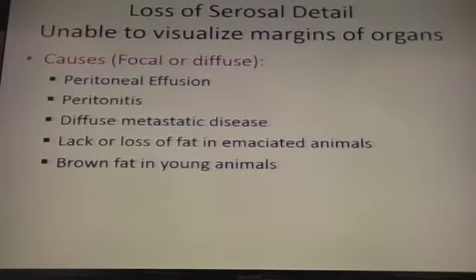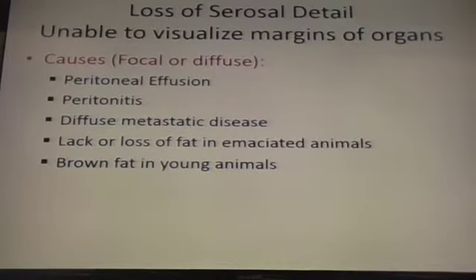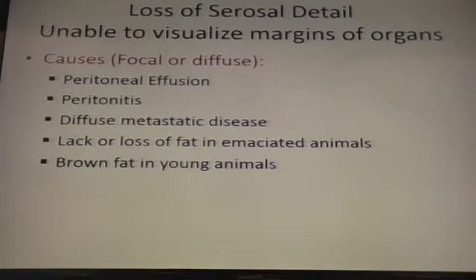So your radiographic diagnosis is going to be peritoneal effusion, because you don't know what kind of fluid is in the abdomen until you do what? Abdominal centesis. Okay, abdominal centesis, yes. Then you determine if it's blood. Now you've got to still do another differential. If it's a transudate, then you do another differential. So every time you say something, you get, oh my gosh, what causes that? That's why? What?